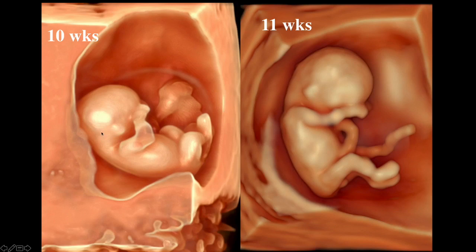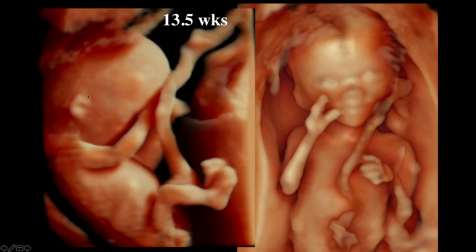You can see the ear here. Look at the ear developing here at 10 weeks and here at 11 weeks. You see an incredible amount of detail here, again, the ear at 13 and a half weeks. You don't typically see this as easily with 2D ultrasound. You really have to hunt around for the ears if you want to see them, whereas on 3D, they're just right there once you render your 3D.